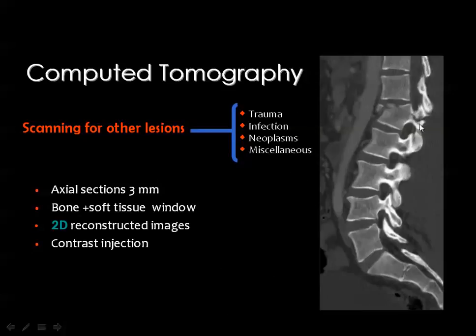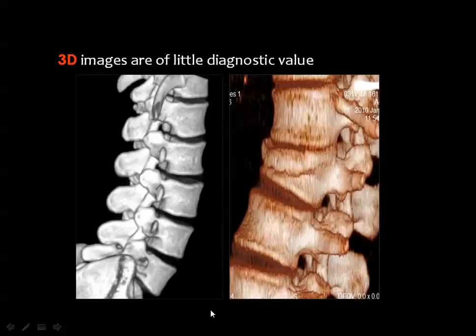And here you see a fracture at the level of the L1 vertebral body with depression of the superior end plate, and the fracture is extending into the pedicle and the neural elements. I will discuss this in detail in the lecture on spinal trauma.